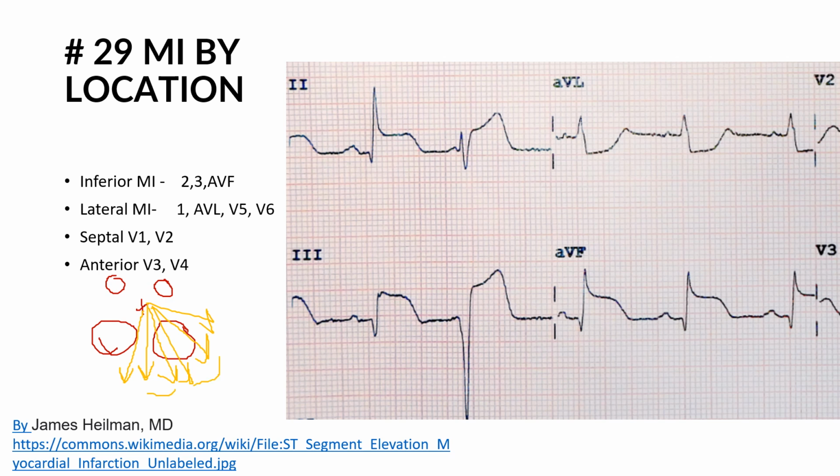These two are right next to each other, as are these ones, right? We already covered these two under septal. Under anterior. We covered these two over here under septal. And then we cover 5, 6 under lateral. So that's why it's working the way that it is.